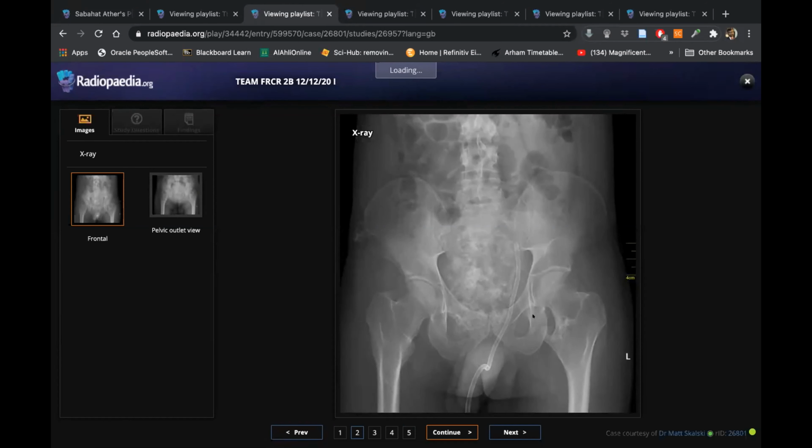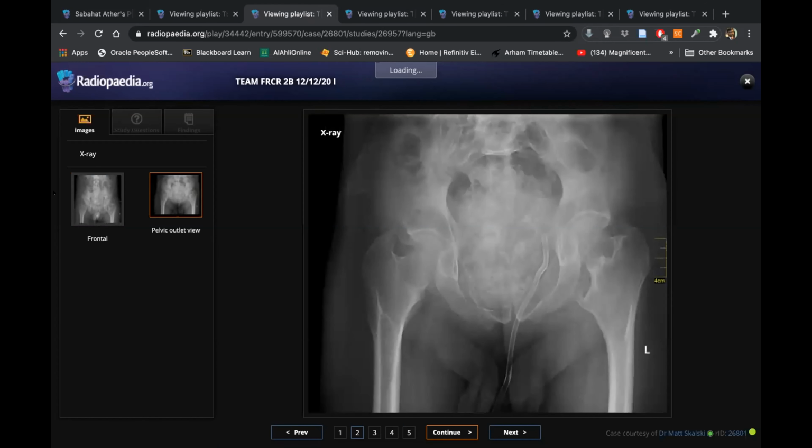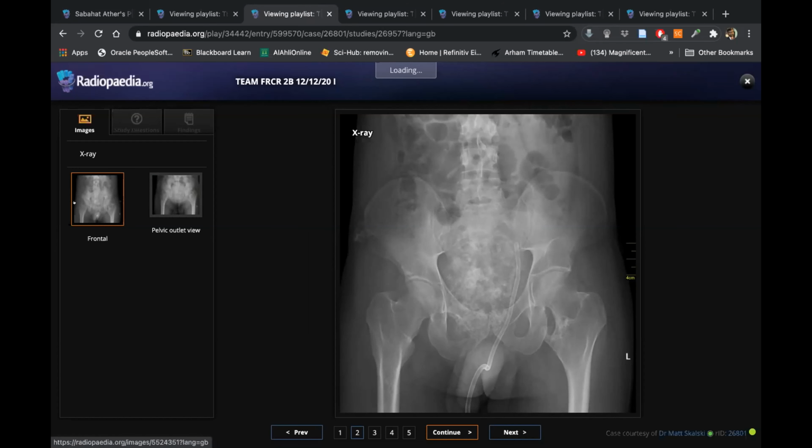Is this something? Okay, there are some osteochondromatous projections. So in that case, it can be multiple osteochondromas. Diaphyseal aclasis is a possibility. What will you do next?